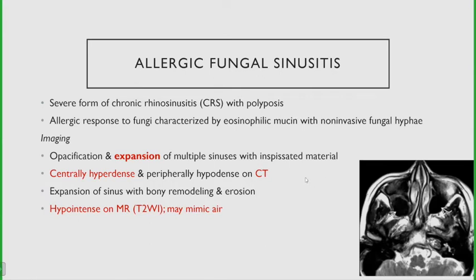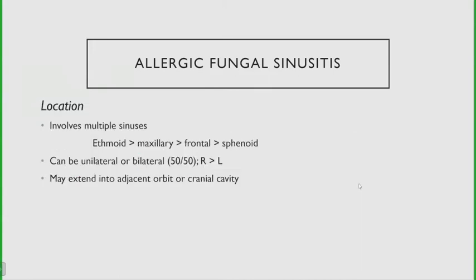Our case is actually allergic fungal sinusitis with sinus expansion, bony remodeling, and T2 hypointensity. Mainly it involves the ethmoid sinuses, then maxillary, frontal and sphenoid. It can be unilateral or bilateral, usually right side more than left. It may extend into the adjacent orbit or cranial cavity.